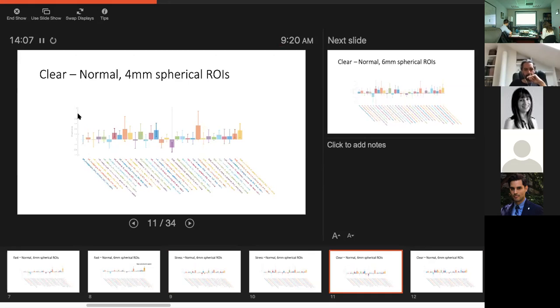Now I'm kind of waffling a little bit on whether or not we should smooth. I mean, we should smooth some, but maybe with 4 millimeter smoothing, because these are actually fairly big. Right, 8 millimeter is fairly big compared to what we were looking at.